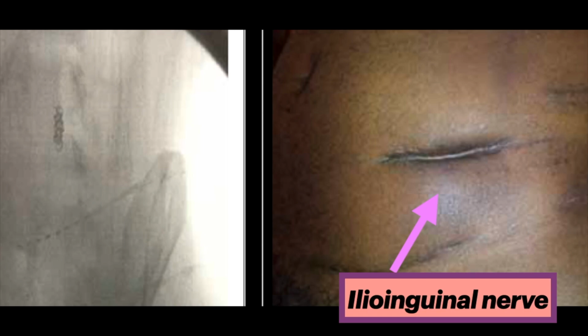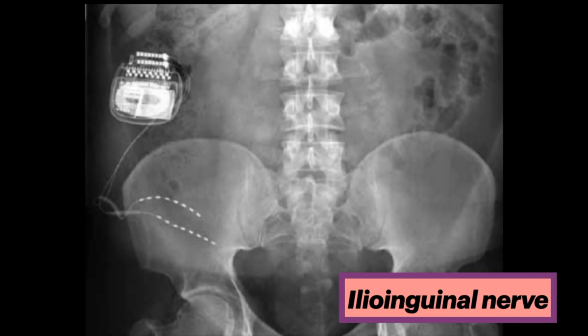Here are scars due to a shrapnel injury and a previous herniorrhaphy at the left lower abdominal wall. We also see subtle scars of a peripheral nerve stimulator. This AP abdominal X-ray shows the electrodes within an implantable pulse generator.